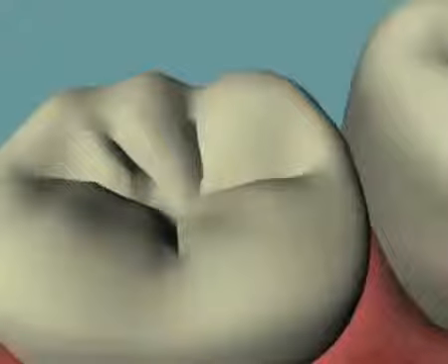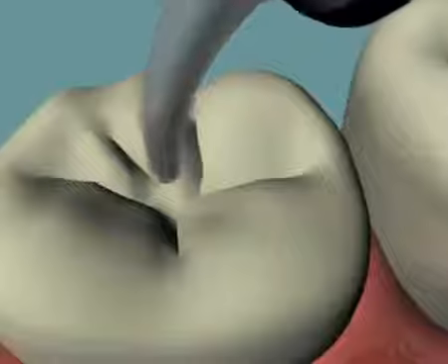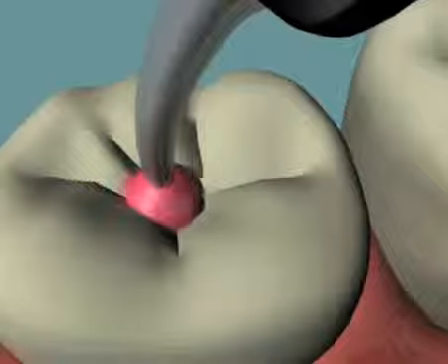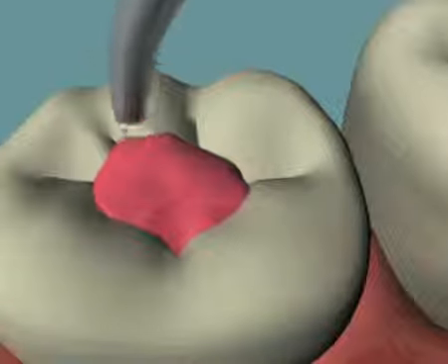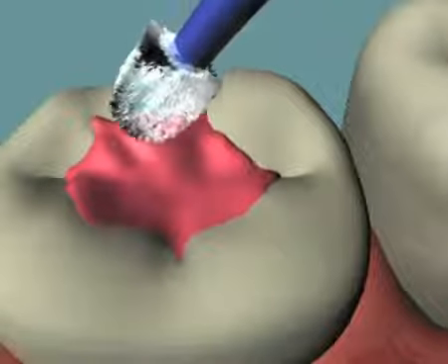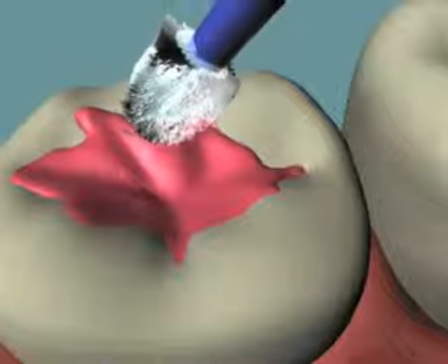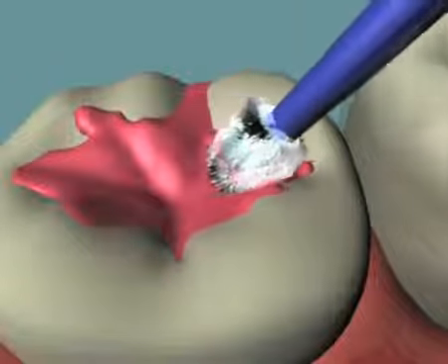The many benefits offered by glass ionomer technologies have led to the development of low-viscosity cements, which are applied to tooth surfaces like a varnish, offering a long-term protective coating for surfaces at risk. Of special focus is the protection of exposed enamel surfaces on erupting first and second permanent molars.